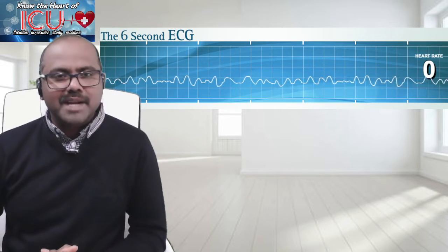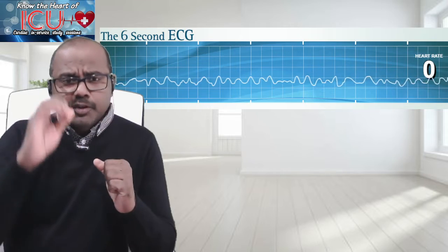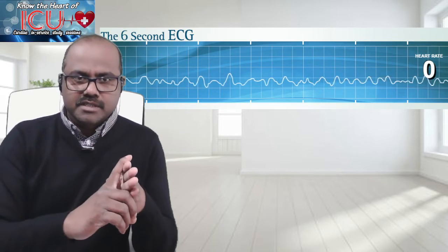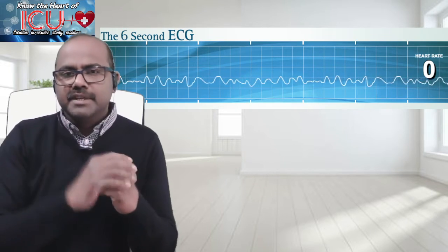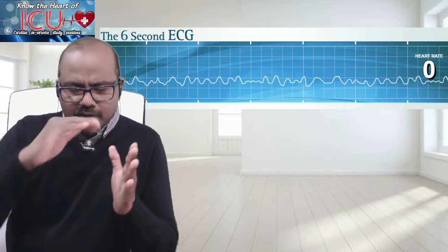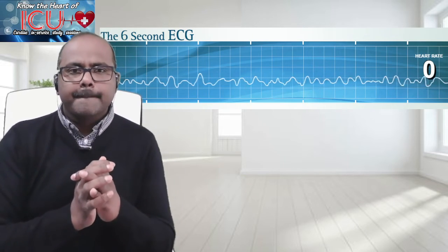It's an easy job if you practice. Only thing you need to remember, how will you identify the source of an impulse? How will you distinguish between SA nodal impulses, your atrial impulses, your AV nodal impulses, and your ventricular impulses? For your SA nodal impulse, you have a smooth curved P wave and you have a PR interval and a narrow QRS complex follows. If it's an atrial impulse, there will be a P wave, but it's of some kind of abnormal shape based on which atria, left or right atria, is producing the impulse.